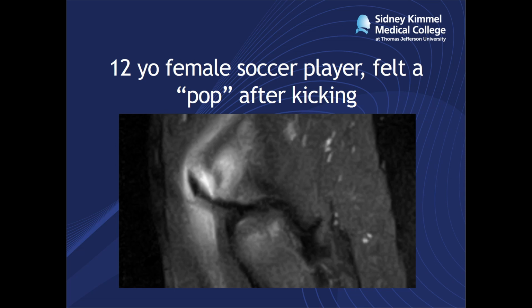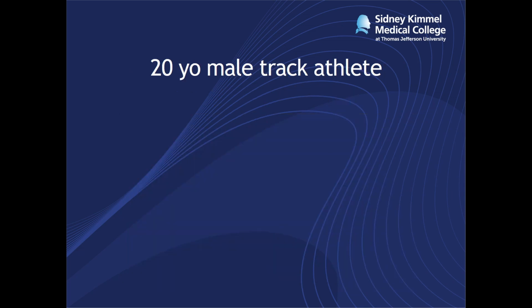You can generate a tremendous amount of force from that muscle, and when that gets applied to the tendon, the apophysis may give way. You can see that was the case in this situation, and there was a little bit of distraction. These injuries are typically treated conservatively. There's a recent meta-analysis from Germany that suggests there may be some benefit from operative fixation if there's greater than 15 millimeters of distraction. So if you do see a gap, it's important to include the measurement, as it may potentially influence the choice of treatment.